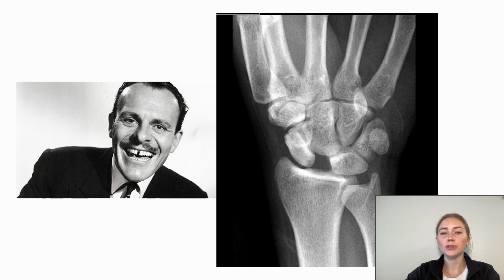Often these patients present several days after an injury with minimal pain and swelling and no fractures, so this is a good one to look out for because the finding is a little bit more subtle on the x-ray. That brings us to the end of the carpal bone module.